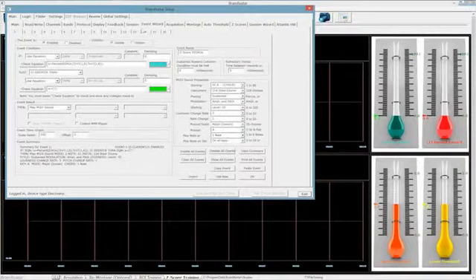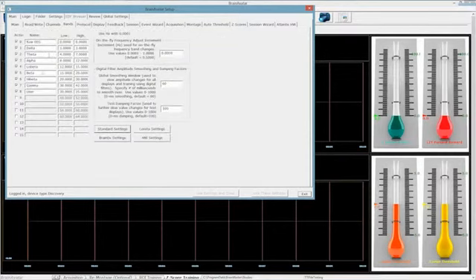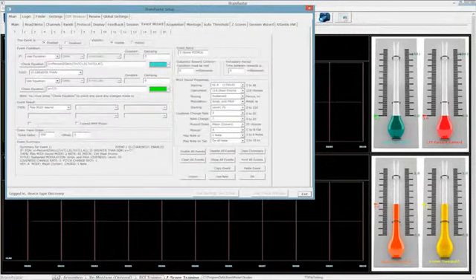Now, what are the positives of this? There are certain people out there who like to do amplitude training on top of their PZOK training. What this allows you to do is that amplitude training by changing the name of the band, and then you have no issue with it. You don't have to worry about changing this at all. This will always be the change.